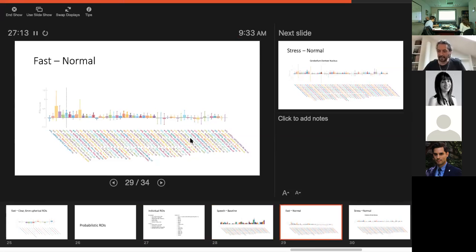Oh well. There's a couple more, I think. Is that lobule 5? Vermis crus 2. Here, this one, and purple, 5 and 6. Are those significant? Oh no, none of these are significant, but these are nearing significance.